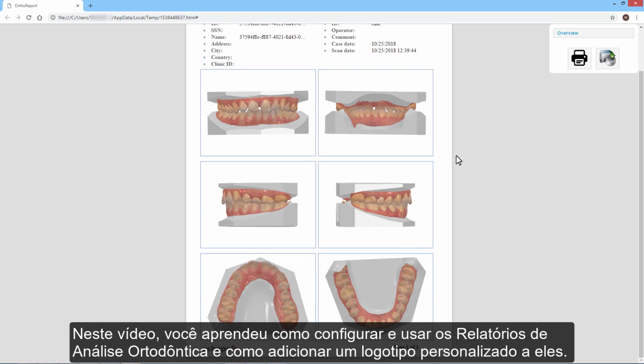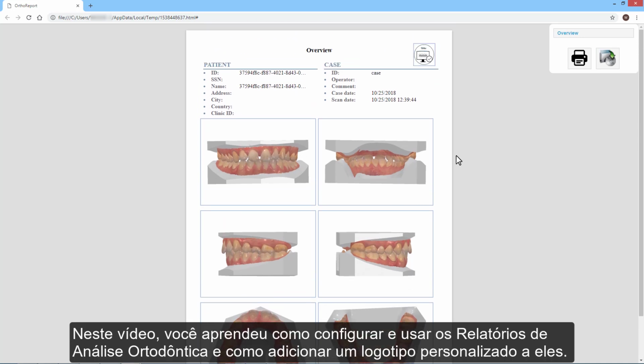In this video, you've learned how to set up and use the Ortho Analysis reports and how to add a customized logo to them.